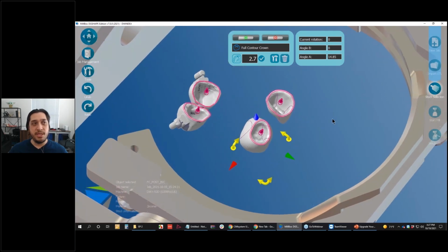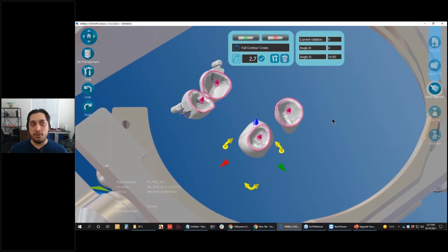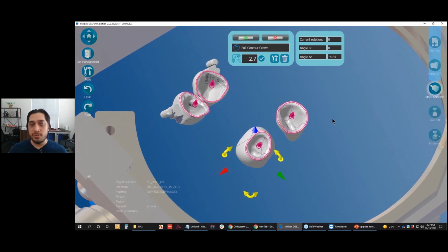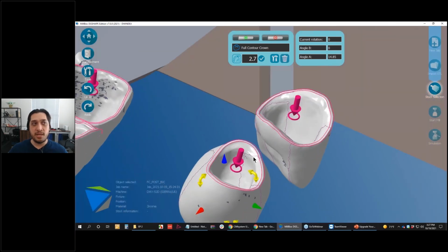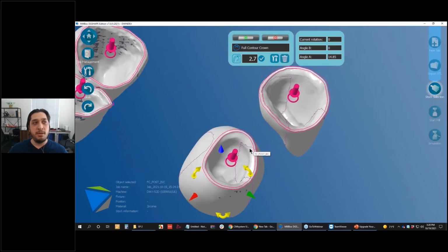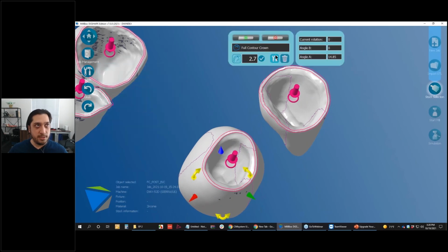So generally speaking, you can have deflection, which can occur if you're using the incorrect cutting parameters or the wrong tool to cut a specific material. And that essentially leaves behind a thin film of material, because maybe it wasn't able to cleanly cut that material away, but maybe it was able to, in a way, melt it away. And so it leaves behind a little residual material. And this is where you can select any part and do this.